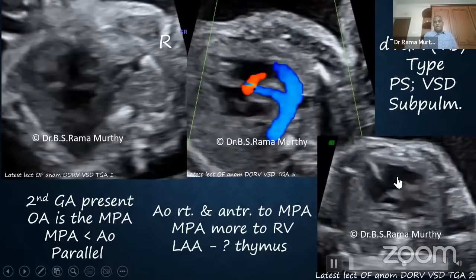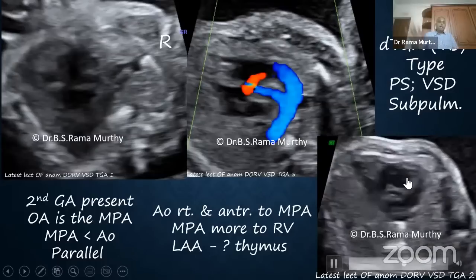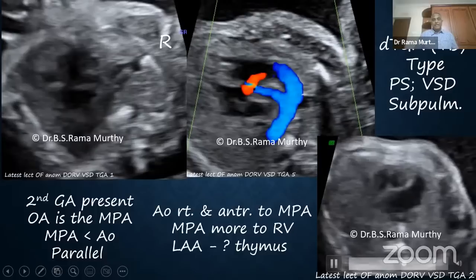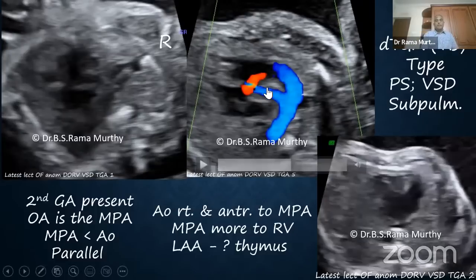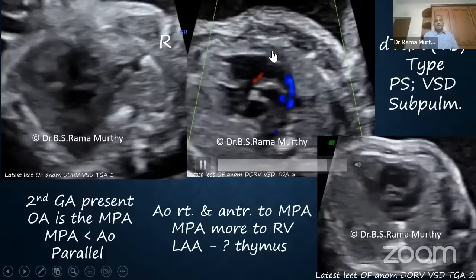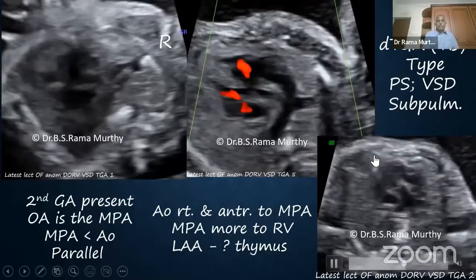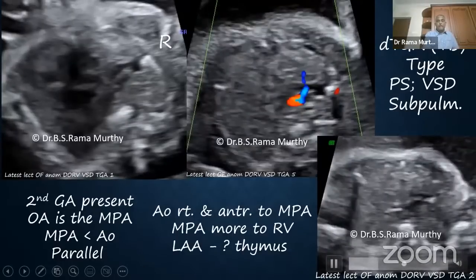And in the same case, you see a right-sided dominance in the four-chamber view, which of course comes later on in the second trimester and the third trimester. And also note that the gap between the great arteries and the sternum is not very much, and therefore I would think of thymic hypoplasia as well. Right, from there we move on.